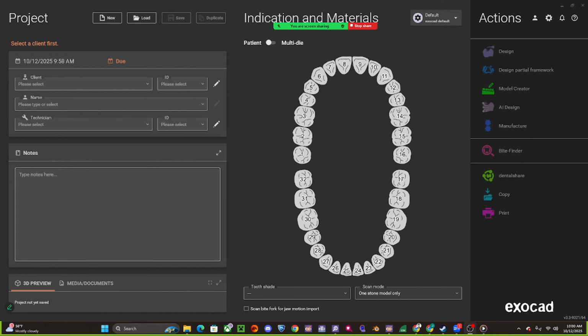Hey guys, what's going on? We have Johnny here and Dr. Omid, and we have a 95-year-old patient who's in dire need of some baseplate and wax rims. Came into his office completely edentulous, and Doc ended up grabbing, what was it? You grabbed an impression of which material?